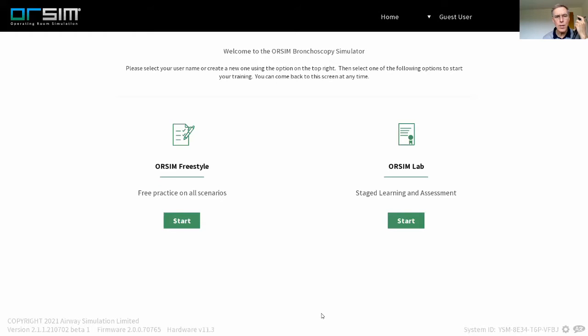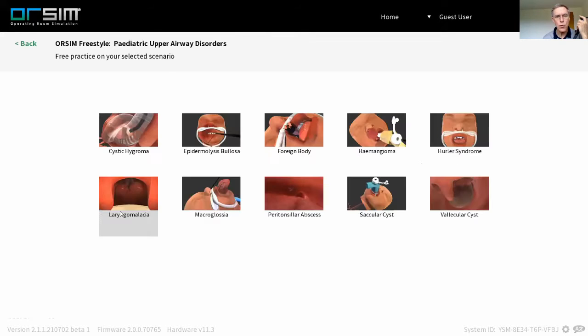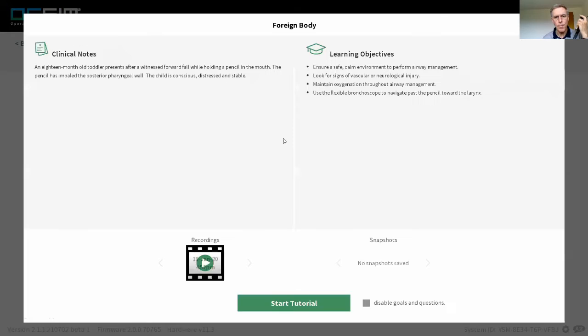On screen here, you can see ORSIM Freestyle and ORSIM Lab. I'm going to start ORSIM Freestyle, and in the bottom left corner are pediatric upper airway disorders. Today we're going to talk about the foreign body.